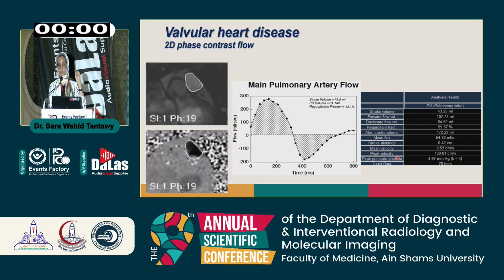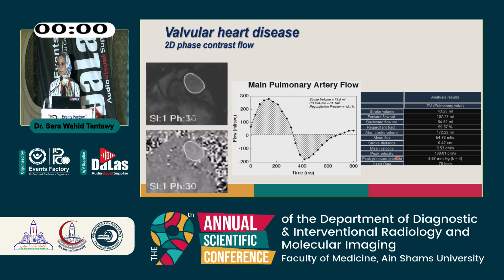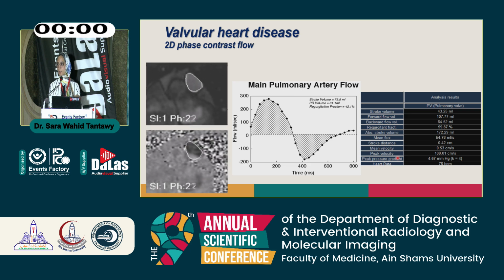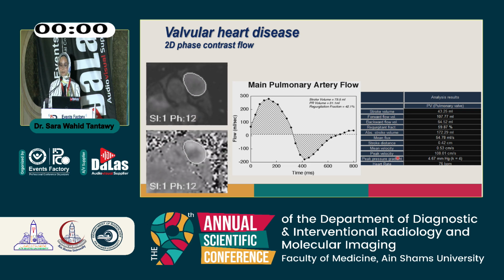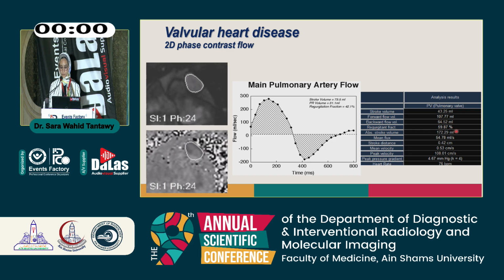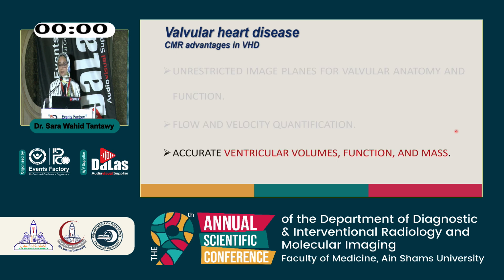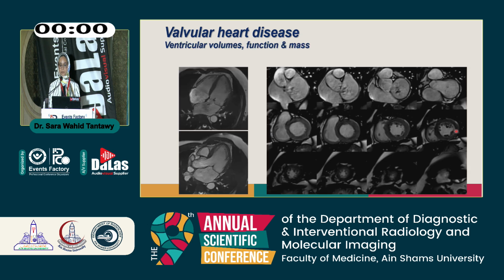You can also directly quantify the regurgitant fraction by automated software. So you can do an ROI and automatically the software detects the regurgitant volume in exact absolute measures and also in a percentage manner. This is hard to do actually along the mitral and tricuspid valves because of their high dynamicity. So instead we have other options to do, like we will mention later on.